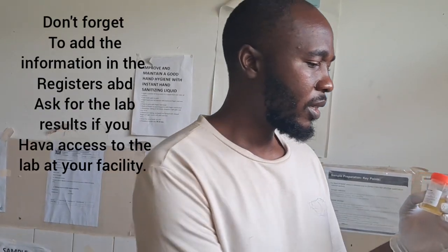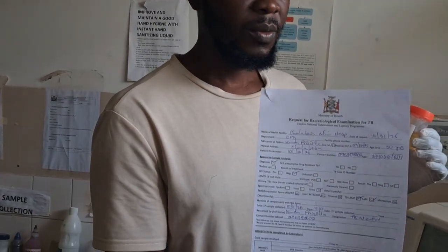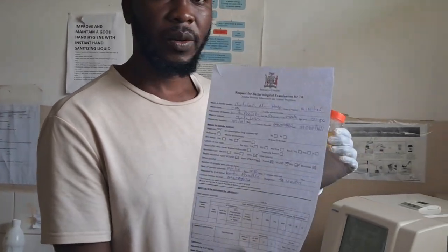Sample storage. Once you have collected the sample, you label the name of the patient. If you are sending them to the lab here, you label the patient's name, location, and date of collection. You also fill up the form. On the forms, I'm sure Madam Kunda will elaborate more, but the forms we use are just the same.